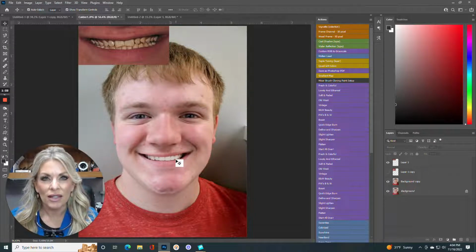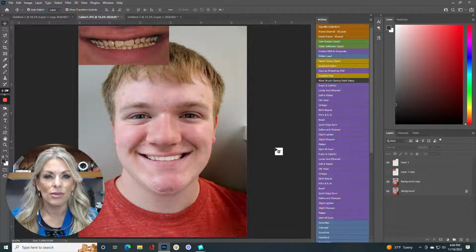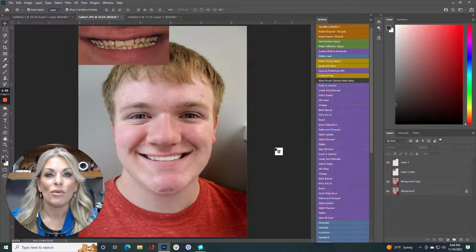There's only so much I could do here because of his bite and his canted on the lower two, but this really gives me some direction going into the appointment. So it was a really fun one. I want to show you the reveal soon.